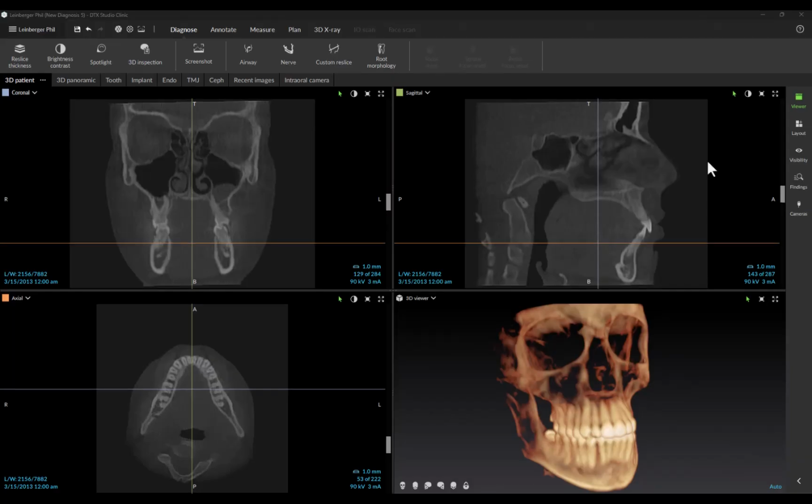So I've had several discussions recently about the iCAT for orthodontic applications, but this video can apply to GPs and surgeons alike. The questions are about the dosage, what the workflow looks like to export a pan and a ceph, how the resolution looks for the lower dose scans, and more. So I thought a video would be helpful, and I'm going to walk you through some of this.